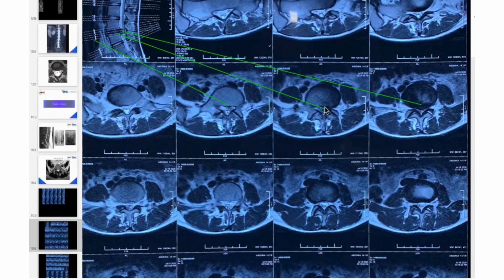Understood now? Yes, sir. And what we saw in the serial sections, that herniation was in the center and was extending into the foramen like this. See this: center, paracentral, extending into the foramen. In the foramen, it is not compressing the root, but here it is compressing the traversing root over here. And we saw in the center that it is compressing all other roots also.